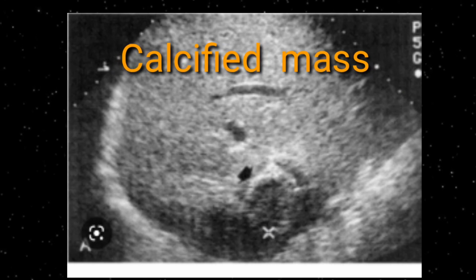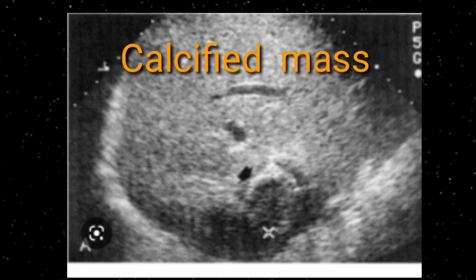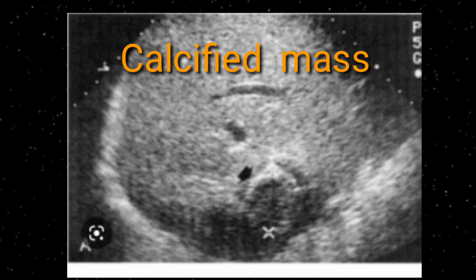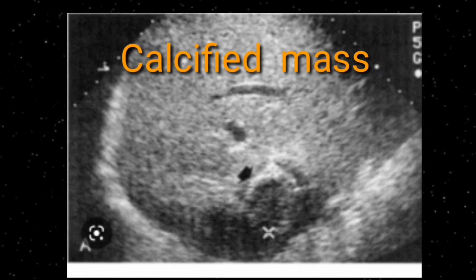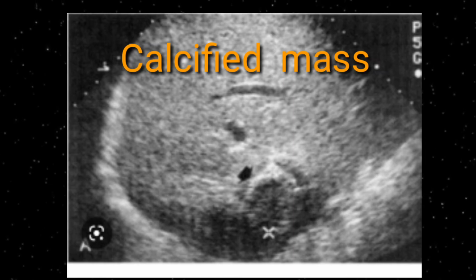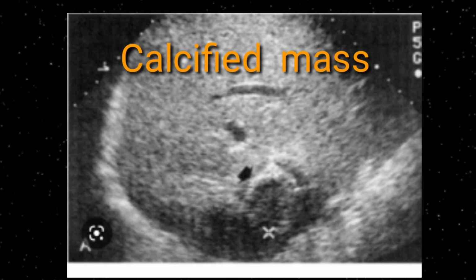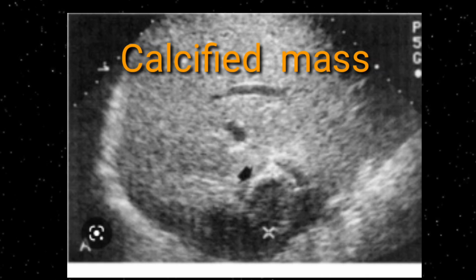In the fourth presentation, sometimes this mass gets enlarged, becomes heterogeneous, and the wall of the cyst becomes calcified. So on the imaging you can see the calcified mass within the liver. That is also a presentation of the hydatid cyst, normally called a grade 4 hydatid cyst.